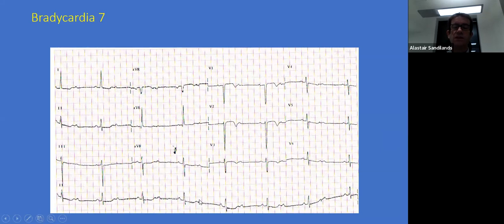2 P waves. Okay, this means that this P wave doesn't conduct through, no QRS. AV node recovered, P, QRS, T. Okay, that's okay. The AV node is poor again, doesn't conduct through that P wave, and then there's another P wave going through, QRS. Okay, so this is an example of second degree AV block, Mobitz type 2, or it can be sometimes called fixed AV block.